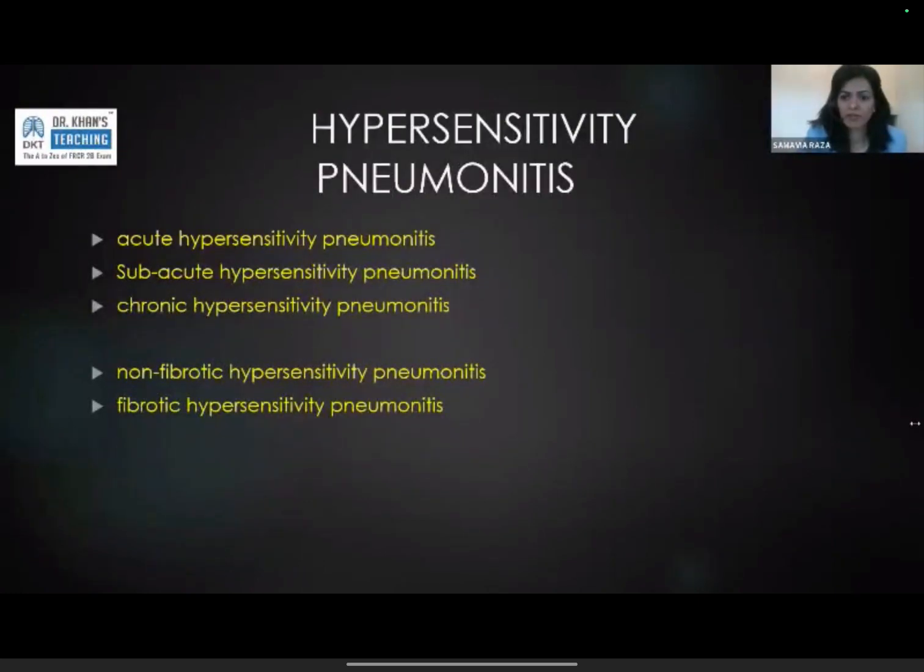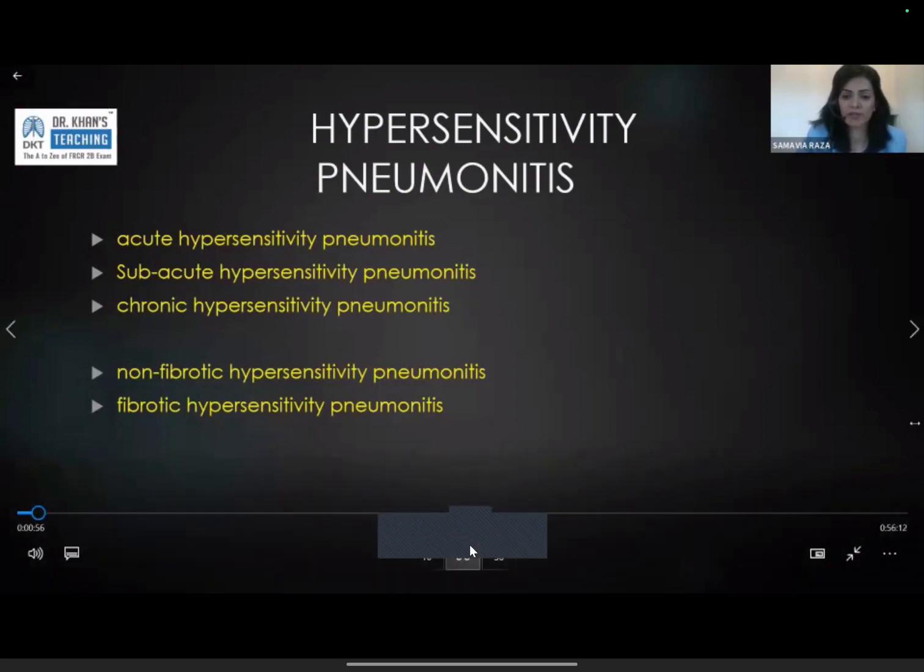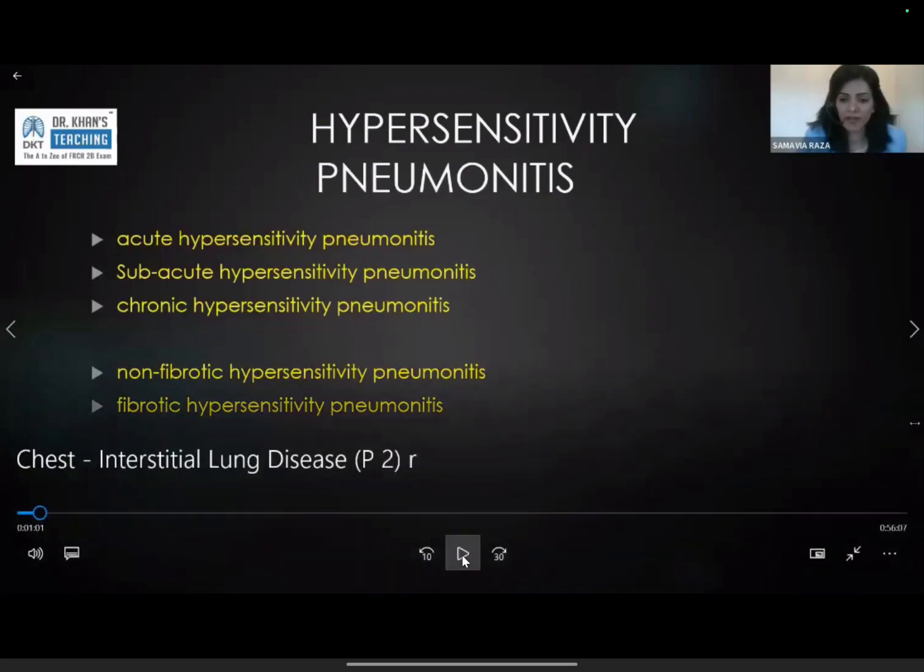Central lobular nodule and tree in bud, how to differentiate. So central lobular nodule is a dot. Tree in bud is literally a tree. So you want to see a branching opacity. So you want to see a bunch of grapes when it's ready.